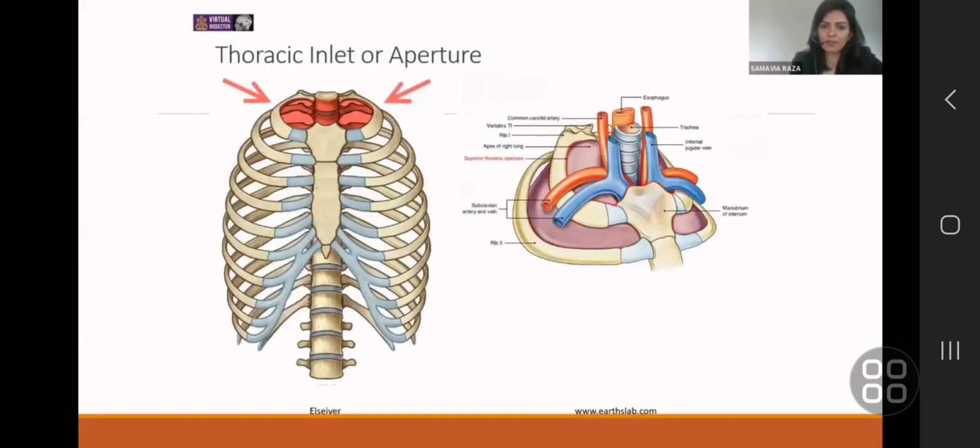This comes back to the other X-ray we were talking about. So this is a diagram to help you appreciate what we were seeing on that X-ray. When some of you had said on the right apex there is a mass, it wasn't a mass, it was these structures, and because the patient was either big or in heart failure or lying down, this was a bit engorged, and this would extend down and turn into the SVC. The way to identify that is as you go lower down, it gets loosened and you can clearly follow it right into the heart.